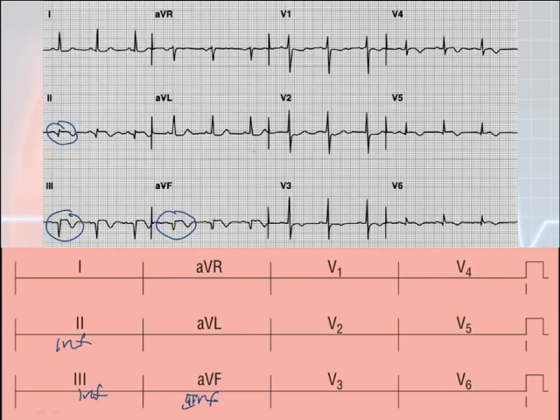It looks like everywhere else is ST segment depression, which would be a reciprocal change, and we're going to talk about that a little bit. V6 might look a little bit elevated rather than depressed, and maybe V5. Kind of hard to tell. There's definite T-wave inversion right there, though, which tells me that there is some ischemia going on in the lateral area. So we could definitely say that this is an inferior wall MI.